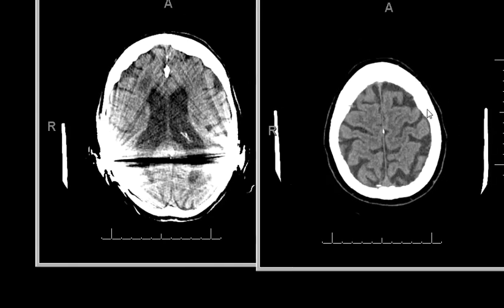So for this case, again, I have always emphasized the benefit of CT perfusion is really to draw our eye to the area of concern and scrutinize all the small vessels. Since we found distal vessel occlusion there, and the ASPECTS score fit, I'm not sure why we didn't intervene on this one, which resulted in further progression and enlargement of the stroke area.